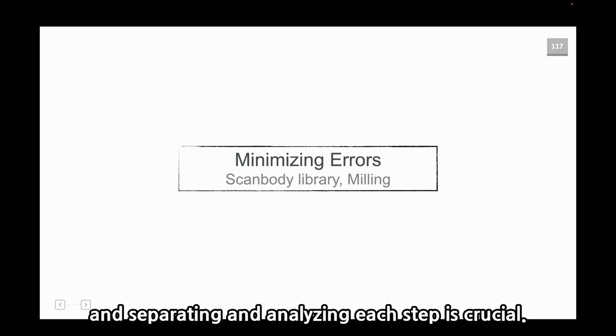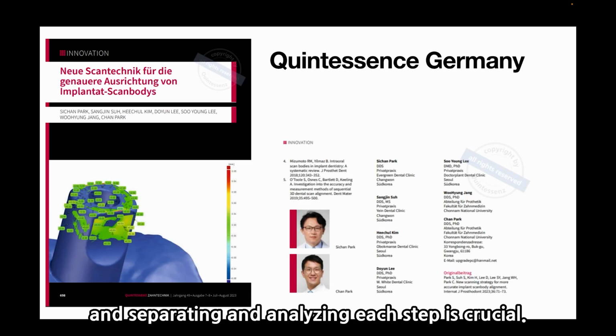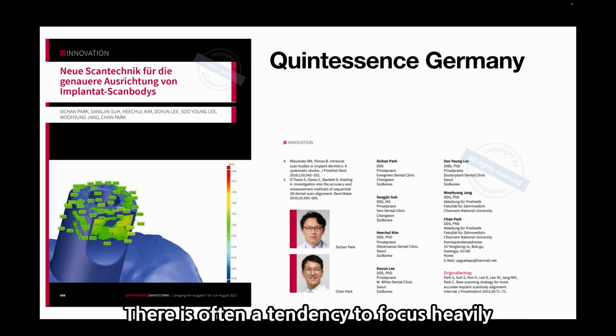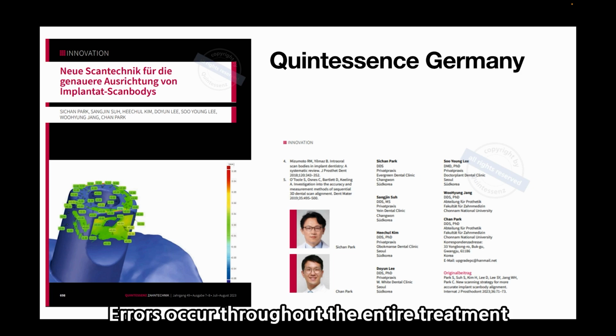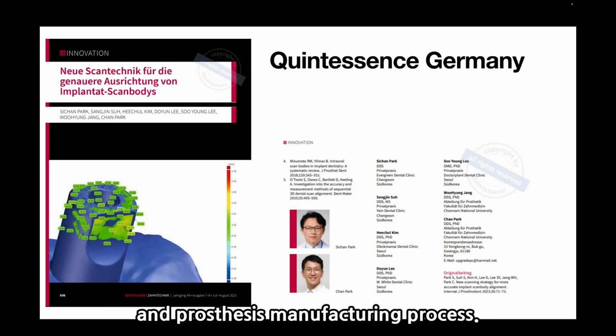At this stage, it is essential to clearly understand the reason for the error, and separating and analyzing each step is crucial. There is often a tendency to focus heavily on the accuracy of the scanner. Errors come throughout the entire treatment and prosthesis manufacturing process.